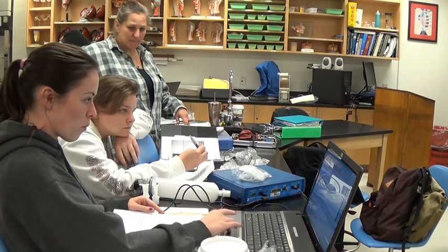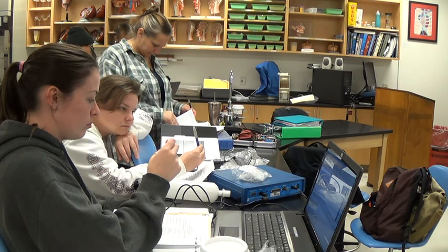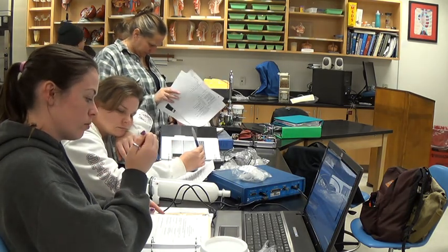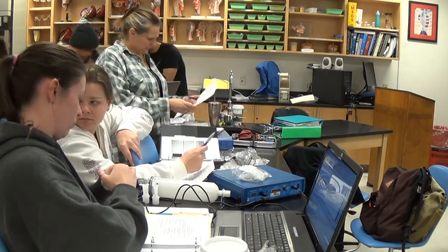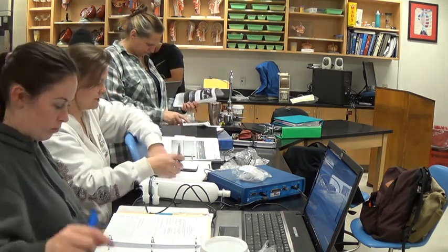That's better than a negative number. So when you do your tidal volume, that's why you only do one. Correct. Okay, so should we do that right now? You want to do it again? You guys got that number? I don't mind using other people's numbers. Just read your numbers.